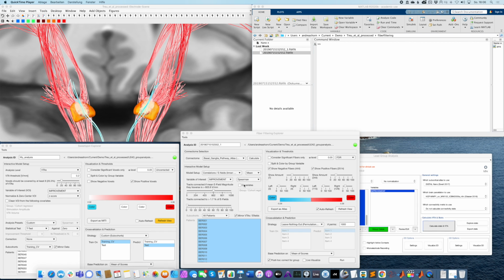Now we can again clean the variable from covariates. In this case, it would even put them into the model, so it's slightly different as in here with the covariates. And if we had more variables here, we would see these here, and we could clean the model from covariates. In terms of correlations, it will do partial correlations instead of correlations, cleaning the variables from these, and if you choose t-tests, it will perform linear mixed effects models, which take a lot of time to calculate.